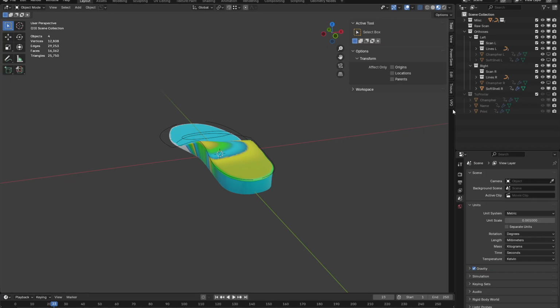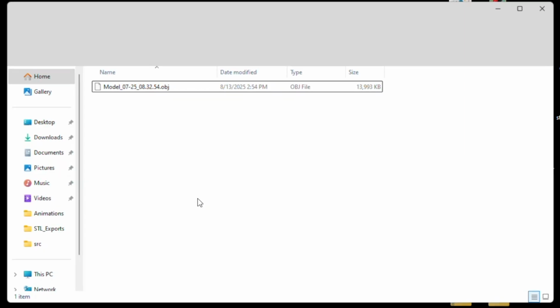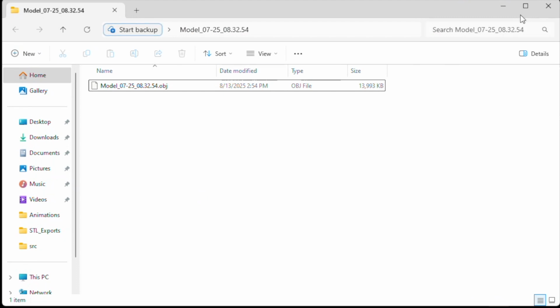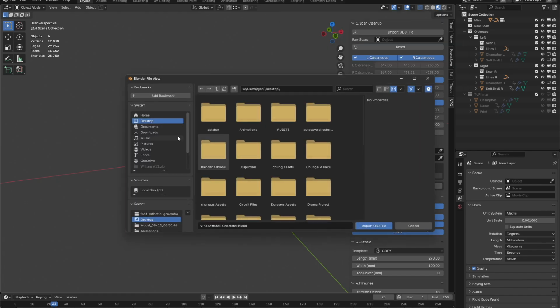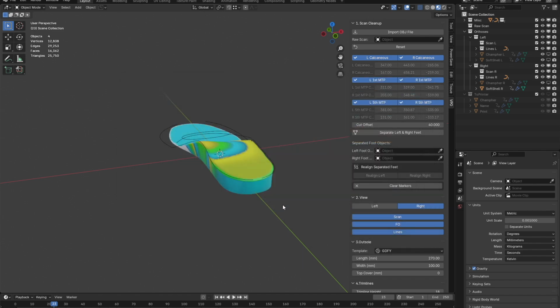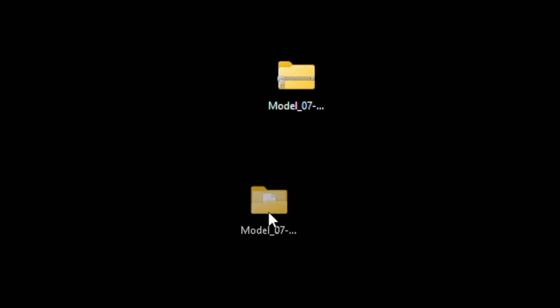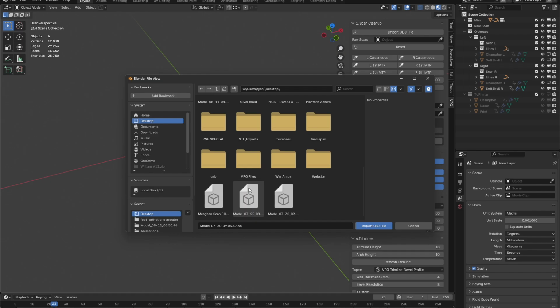First, make sure we have our VPO menu selected and in view, as well as our 3D scan accessible to our computer. Click on Import OBJ File and navigate to where your scans are. I've been working with Jesse from Simply to hopefully integrate a folder where you can search up patient names, but for now, just download the files to your desktop and import them locally.